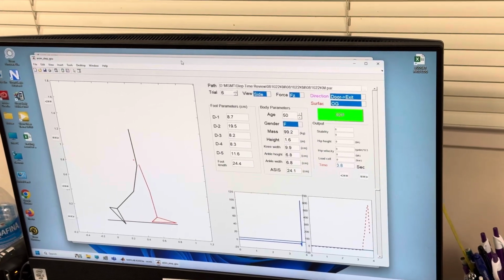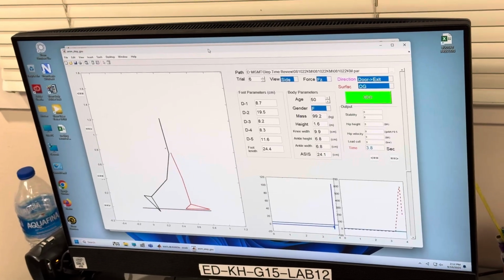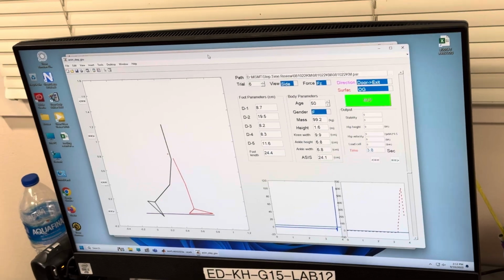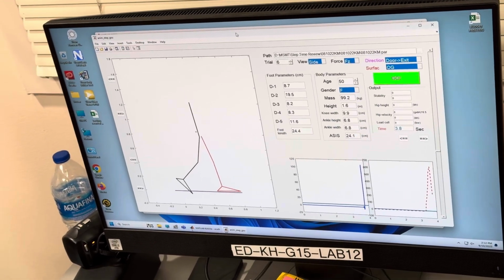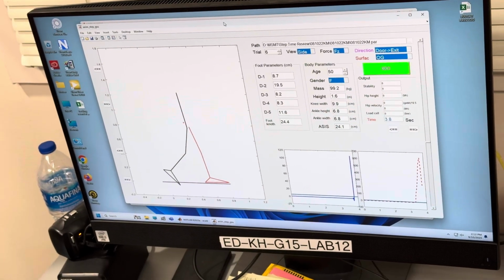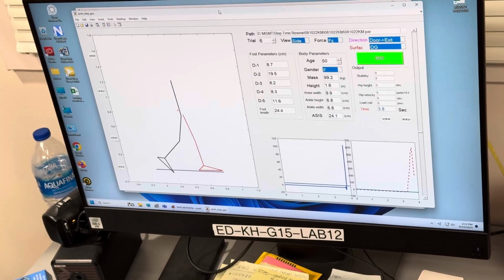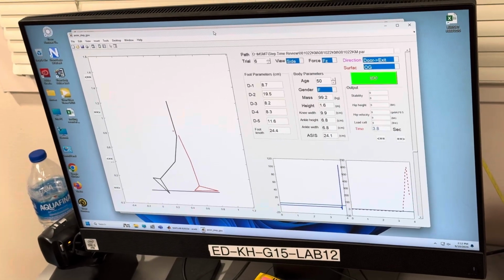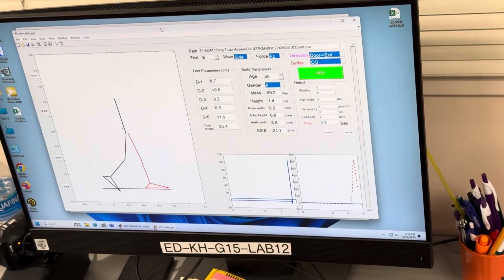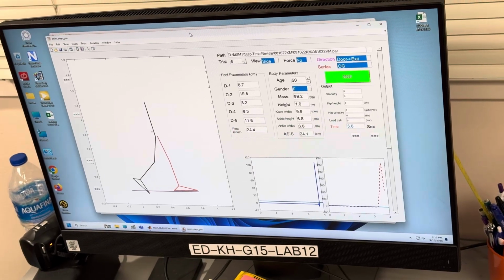What we use this for is to identify manually all of the touchdowns and liftoffs of every trial that involves walking or slipping or tripping. So anything like over ground walking, we do this for, and everything on the treadmill, except for the fake trials where they stand and don't do anything. You don't have to do anything for that. But any trial that involves any kind of step, like a recovery step from a slip or a trip, gait slip, stuff like that.